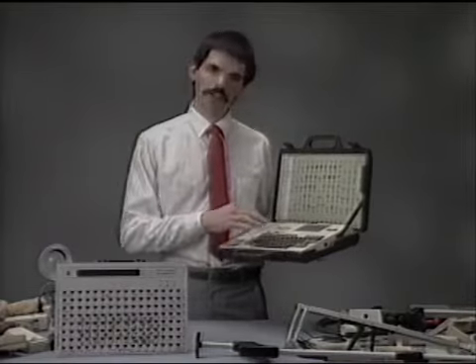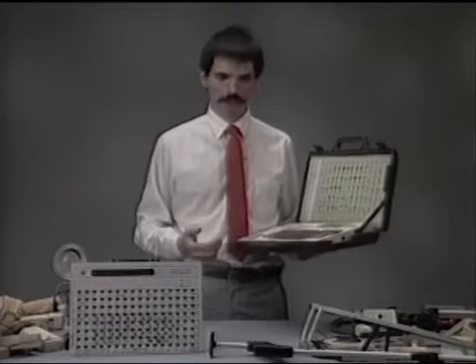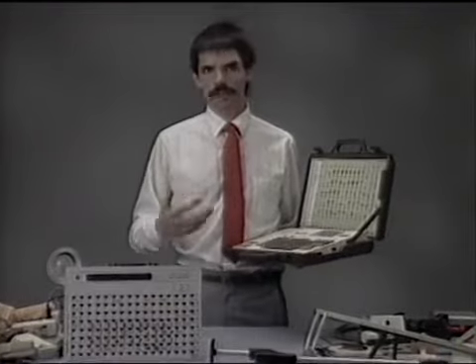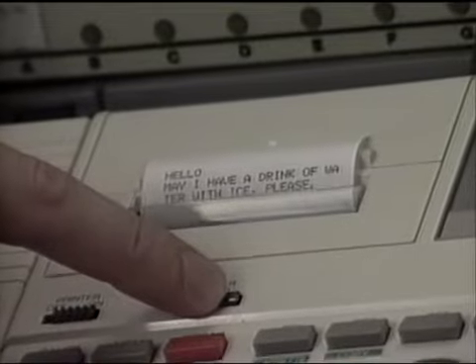This particular system uses logical letter coding, meaning that I can take 2 letters to logically put out a whole sentence. For example, again, drink of water with ice, please. Maybe you think of may I have a drink of water with ice, please, as DW, the 2 letters DW. And by hitting the letters D and W, and actually I've programmed this in beforehand, I can hit return. May I have a drink of water with ice, please? And if you weren't able to understand that, I can also print up the entire phrase.